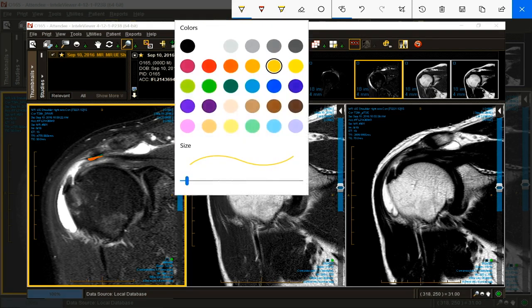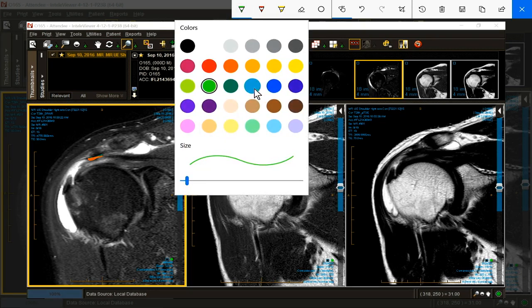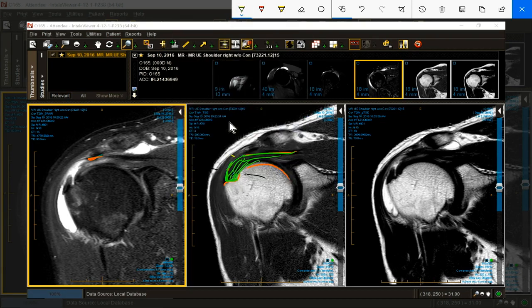Let's put our cuff back now. Let's put Humpty Dumpty back together again. What if I had an articular surface tear, and my tear, instead of going north by northwest towards Broome and Perth, it decides to go towards Queensland? It goes this way, or maybe towards Brisbane. But it doesn't go out into the ocean.